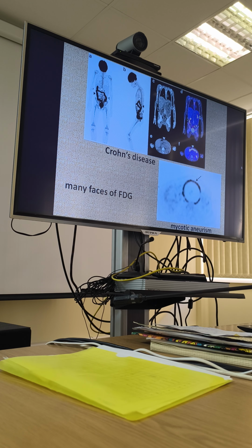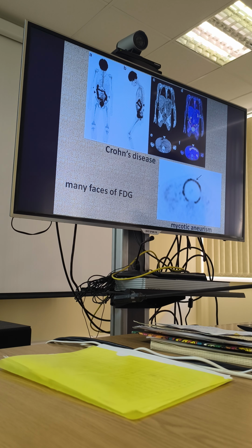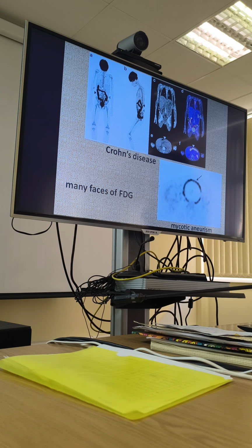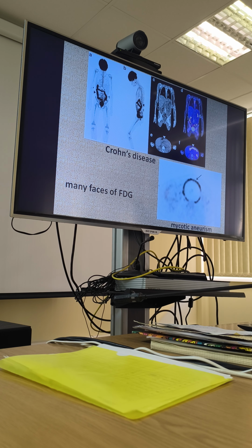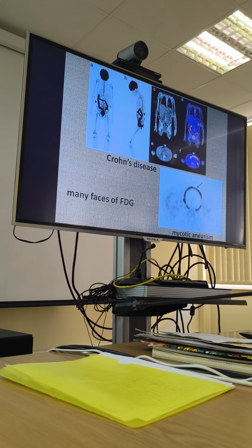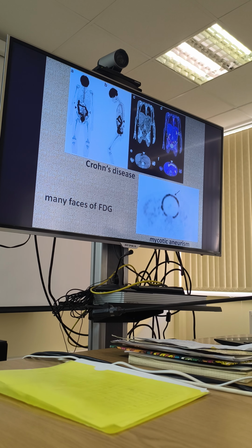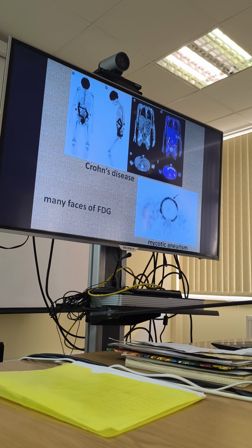Like in this patient who has a big aortic aneurysm, and it was stented. We placed a stent there, and this stent is all infected with this mycotic infection, and so that is a really practical way to look for this infection, because close to the metal we have problems with performing all our diagnostic modalities. CT and ultrasound and MRI, they don't like metal, and it's really difficult to see something in detail close to this thing. So this is a solution in this situation.